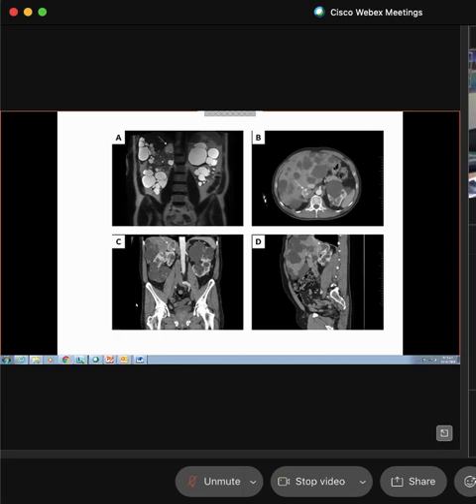I see some change-ups here, a lot of coronal, and that is absolutely true. We still see the patient's left side, and we still see the patient's right side. However, what we don't see is what we saw here in this one. We still see the hips and the ilia. We see the hips and the ilia, right?